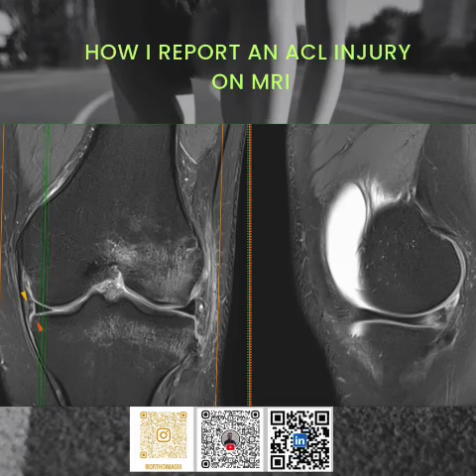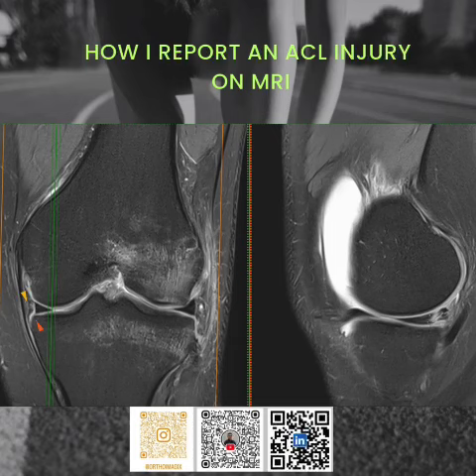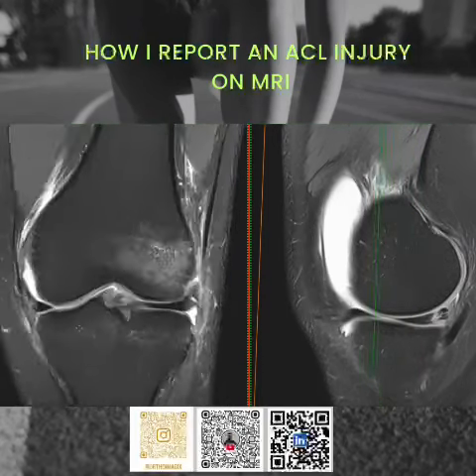Apart from that, we need to look at the status of menisci both on the medial and lateral aspect, the articular cartilage, and rest of the structures. On the medial aspect, we will look at the medial meniscus, which is the most important cushioning portion, the fibrocartilage. And here we see that there is a peripheral longitudinal tear at the meniscocapsular junction at the site of meniscotibial ligament attachment. So this is a ramp lesion, while the rest of the meniscus looks perfectly okay.